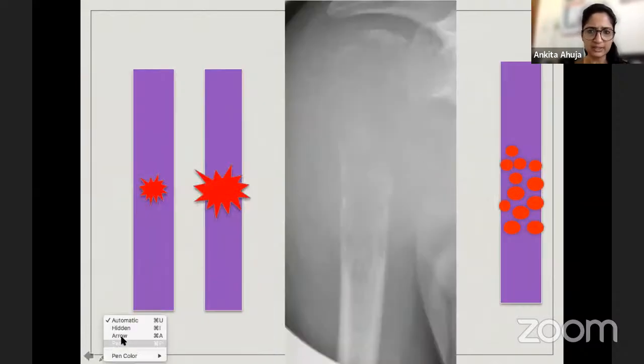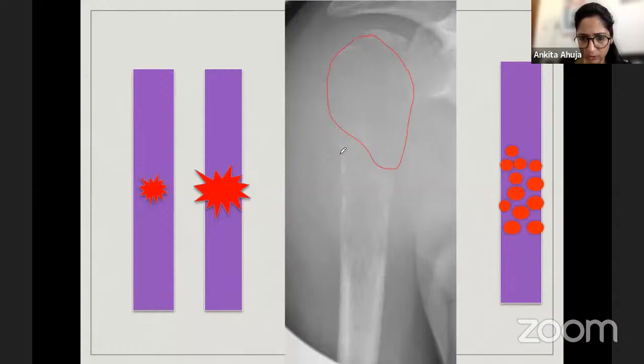So if you look at this lesion, you can see definitely first step identification has been done. But if you see, you are not sure till what level here the lesion is going. You can only see this, but the lesion is all over here, and you really don't understand till what level the lesion is going over here, right?